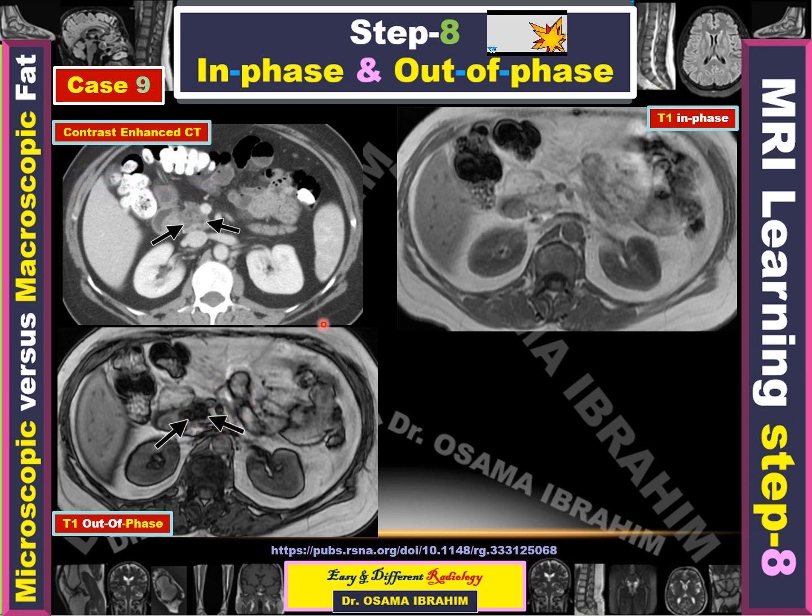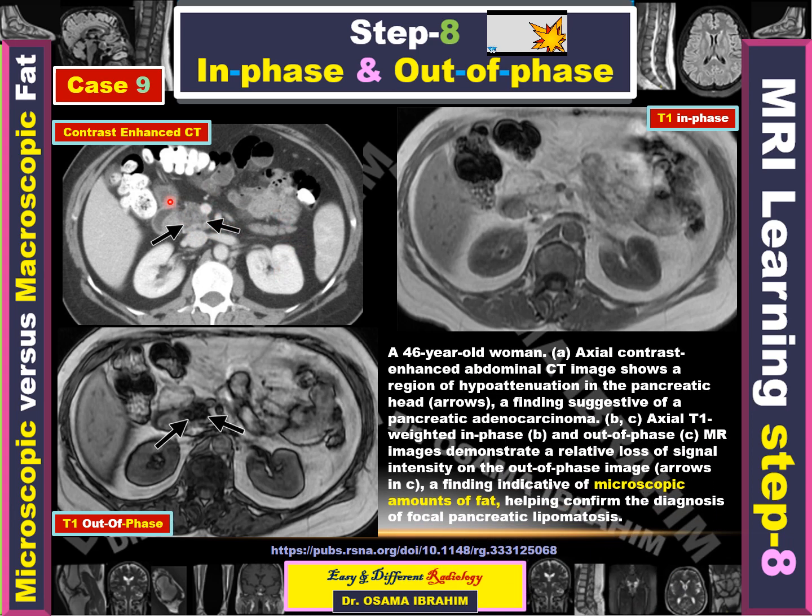Yes, it is suppressed. What about this sequence? This is actually not an MRI sequence, because the subcutaneous fat is dark signal and the bone appears high signal, and this is CT with oral and IV contrast enhancement showing the lesion at the head of the pancreas. From the CT alone, you can diagnose this as adenocarcinoma of the head of the pancreas.